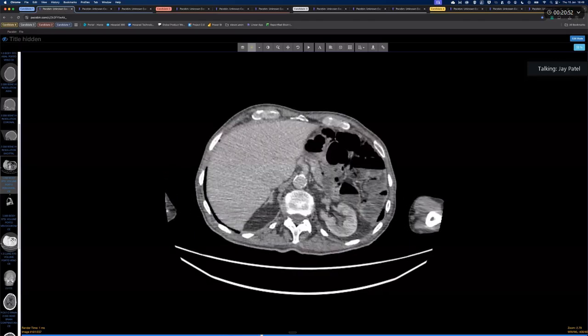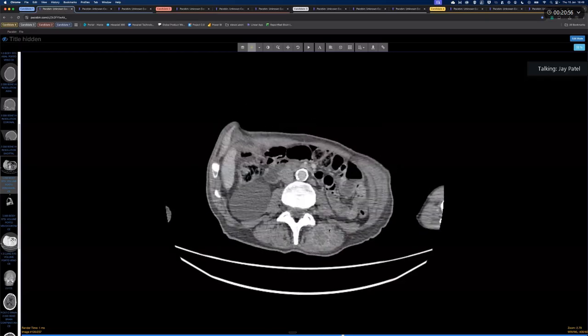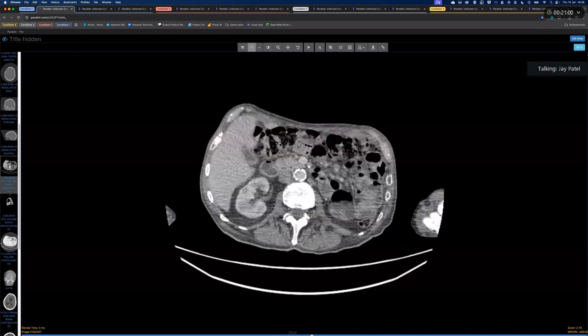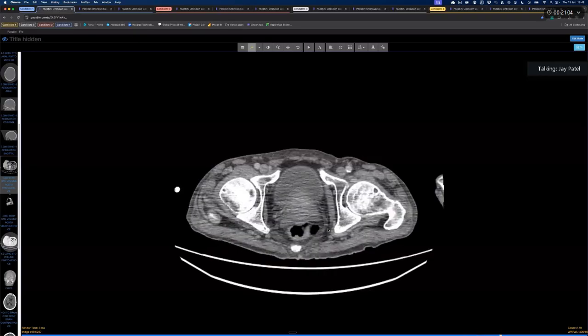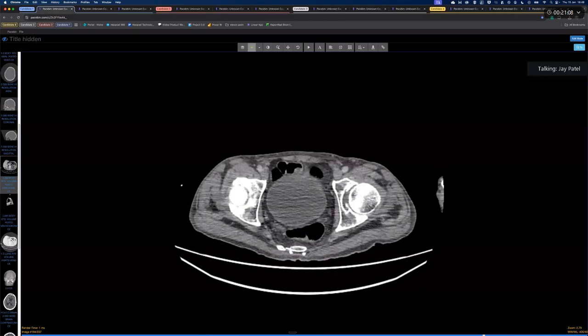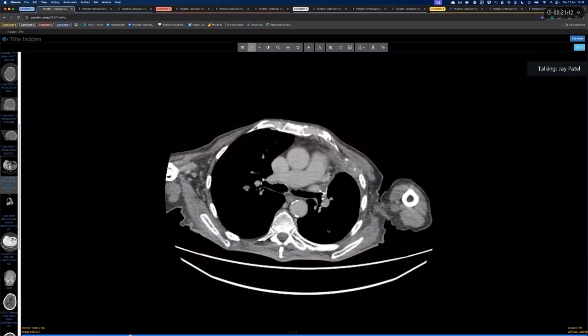Scrolling down to the bottom, I see a renal cyst, there's aortovascular disease, I can't see any large liver metastases, and the prostate looks a bit big. So the biggest abnormality that I saw on very quick review was the thoracic finding, so I'll concentrate on that.